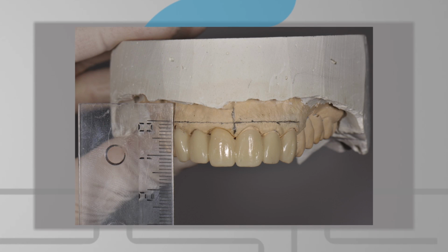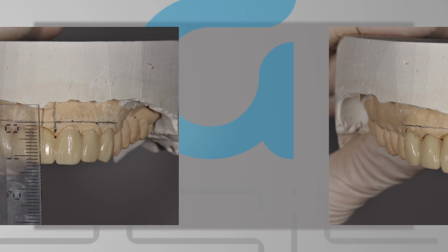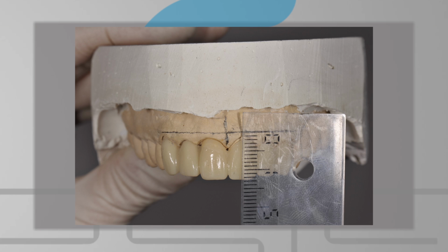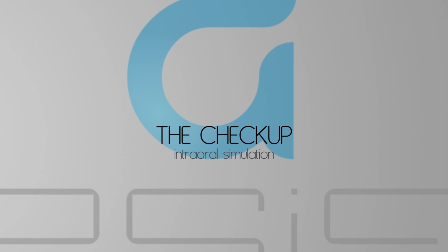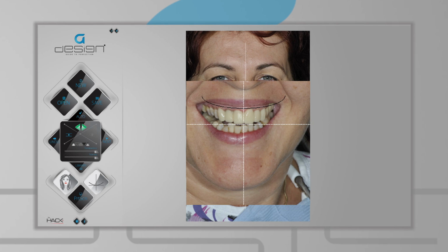Checkup of the temporary restoration of the diagnostic wax-up against the horizontal axis. The checkup is another very important use of this application.